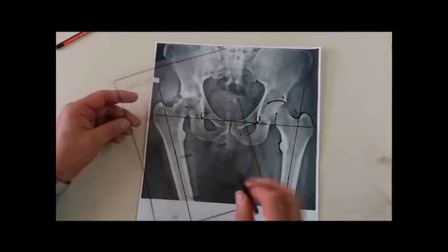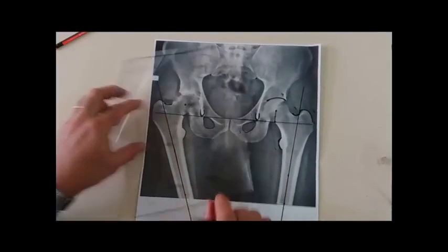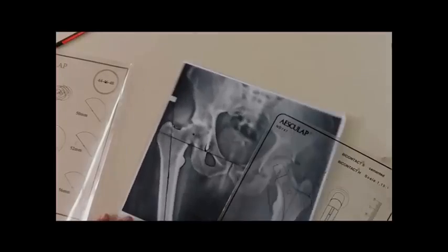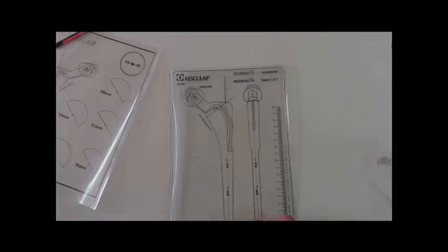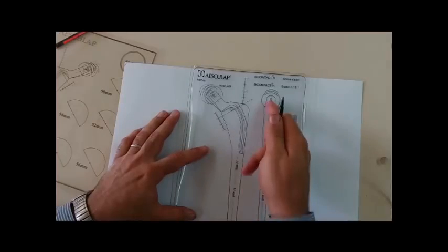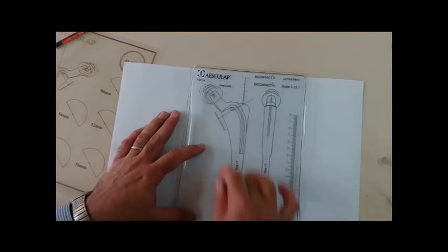Setting the implants is on both the acetabular as well as the femoral side. Before I go to the fourth step, I think that we should explain the criteria of the templates. An example from one company is a template for the femur as well as for the acetabulum. This is of course the template for the lateral view, because templating in AP and lateral is routine. We are explaining in this video only AP, and this is the template for AP.